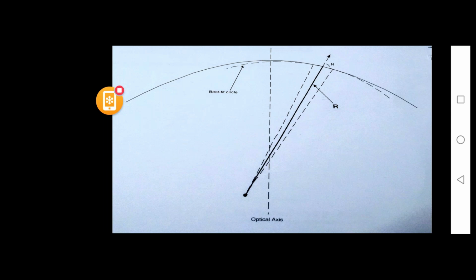Over here, you can see this tangent arc is drawn and it touches the cornea at only one single point. So this arc is taken and completed as a circle over here. Let me repeat myself. A tangent is drawn, and that tangent is then completed to be a circle, and the radius of this circle is considered to be the radius of curvature of that specific area.